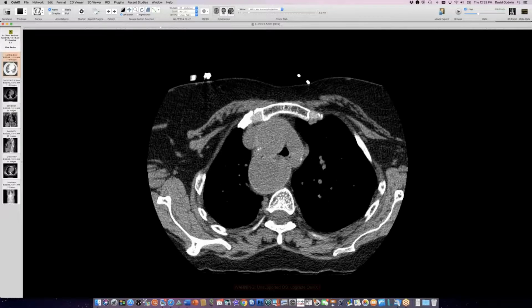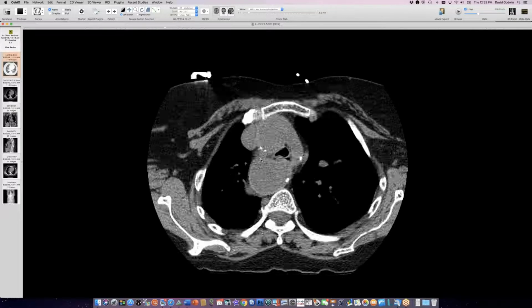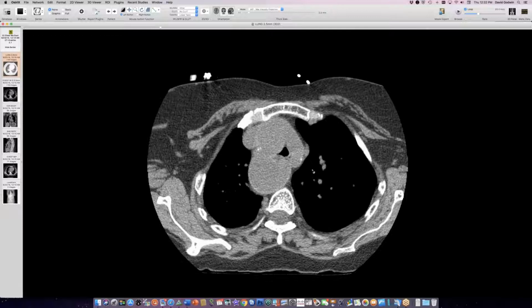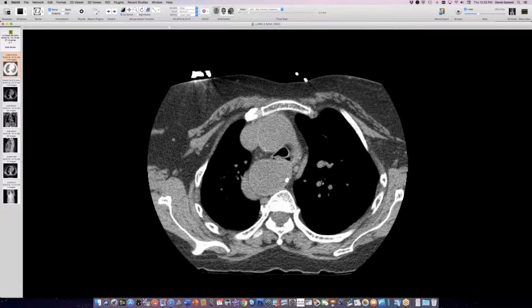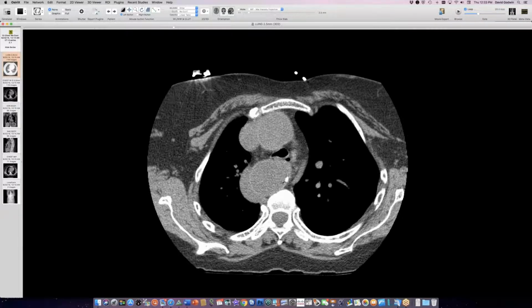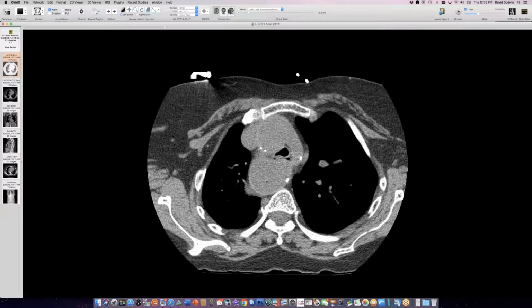It's a non-contrast CT, but the abnormality on the left that is causing the convexity, the mediastinal convexity, is actually a left aortic arch. And so I thought this is going to be another one of our double aortic arch with an atretic segment, except that there is no atresia back here. So this is actually a continuous double aortic arch, and it is encroaching on the airway, and it's dragging, because there's a left moiety here, the descending aorta is being dragged toward the midline to connect with this.